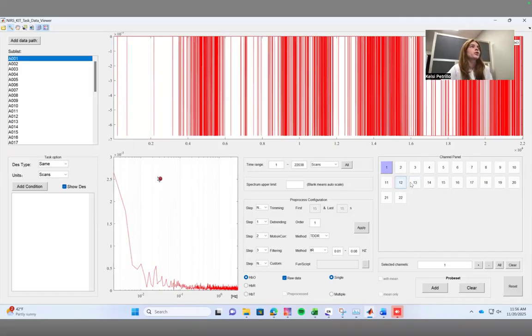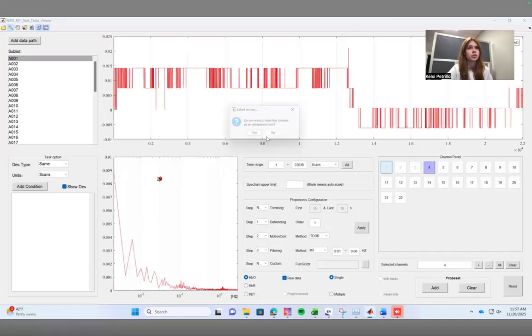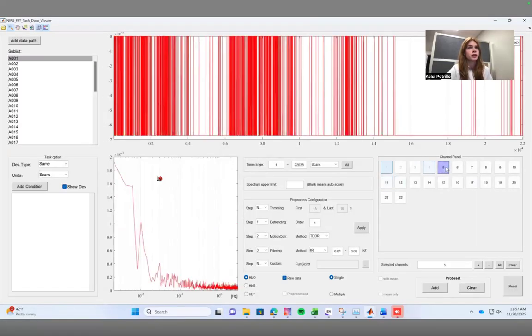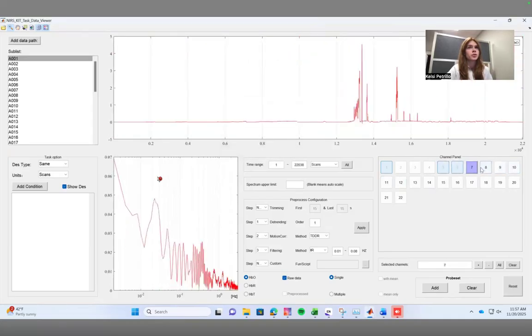So when you come across the bad channel, what you're going to do is right click on that channel and you're going to mark it as an exceptional one. And what that does is it tells the NIRS kit that you don't really want to consider that channel in your future calculations. So like I said, this person has a lot of bad channels. So if I was looking at them, I would go through and exclude all of these channels where I cannot see good signal quality, which might be most of these.